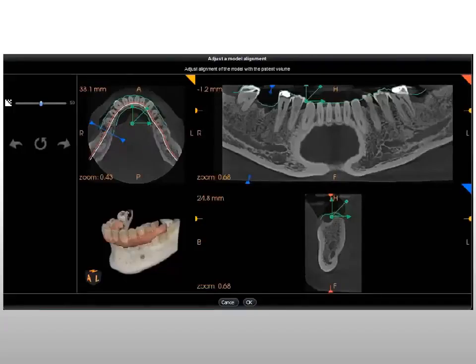To move the model, select the model outline or one of the grab handles and drag it to a new position. The grab handles enable constrained movement, left and right or up and down, to ensure greater precision when repositioning a model. To move an object without any directional constraint, click on the omnidirectional grab handle.